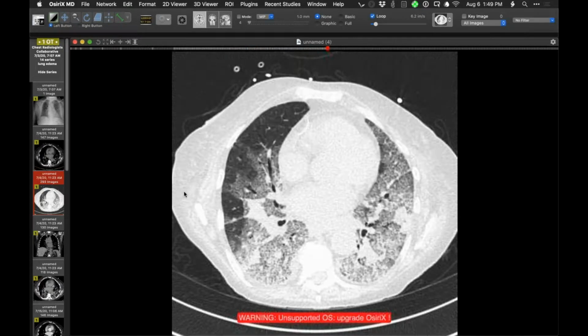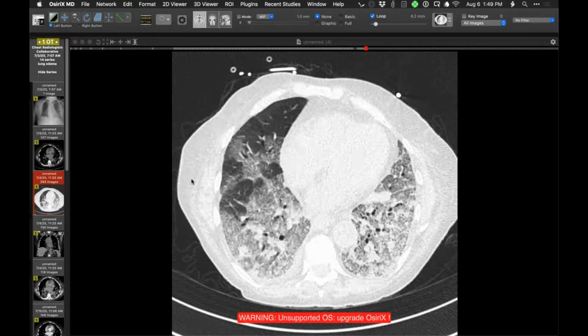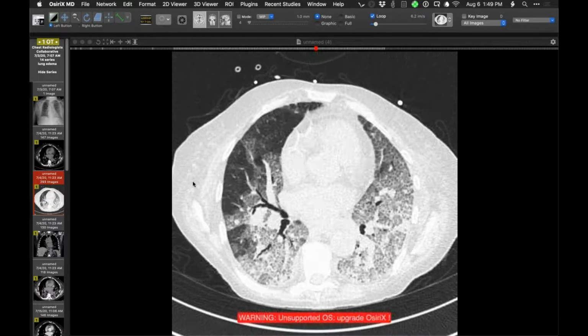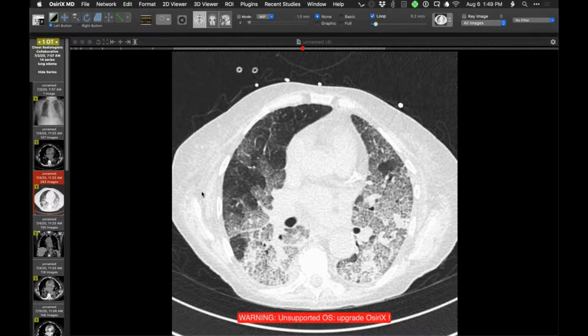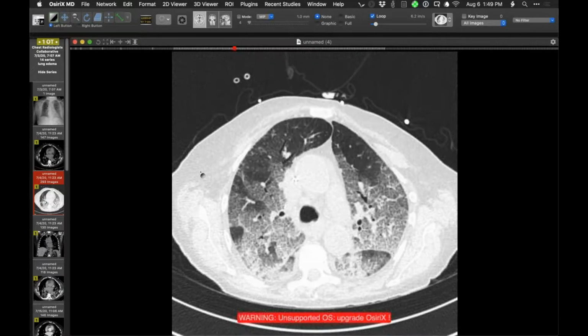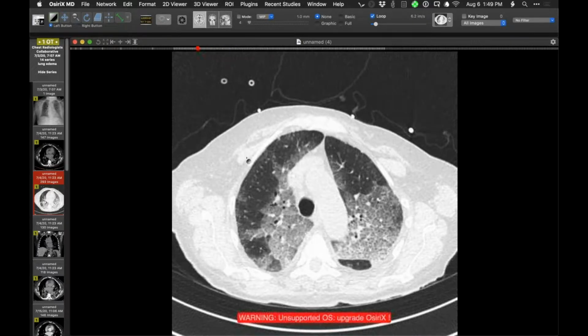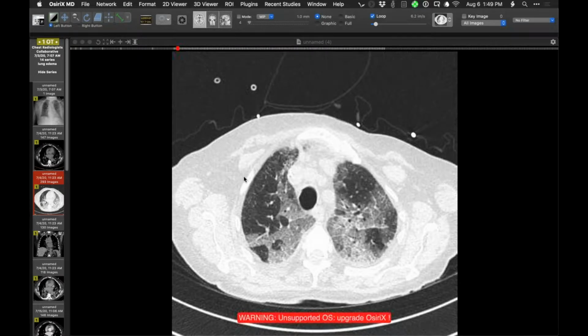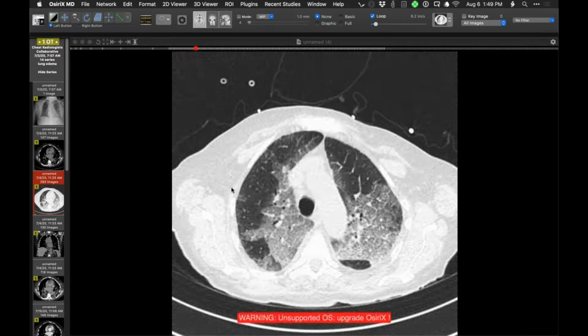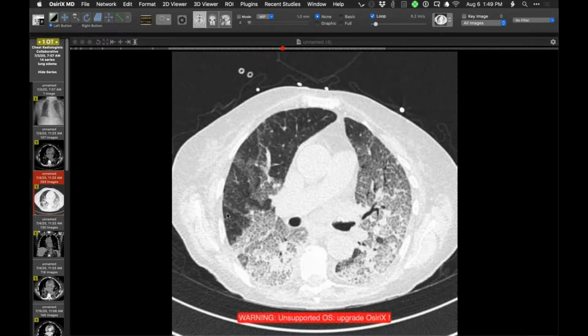And I find it difficult, in the situation when we see crazy paving, to know how much of the abnormality is actually in the interlobular septa versus just in the lobule adjacent to interlobular septa. But certainly, I don't see lots of typical septal lines, particularly in regions like this, or peribronchial fluid cuffs, for example, of interstitial edema in this person with this extensive abnormality.